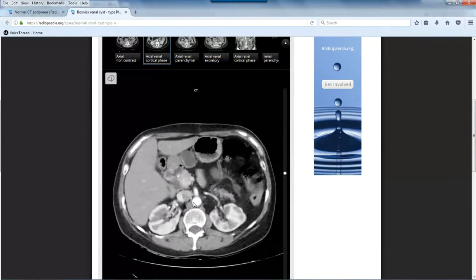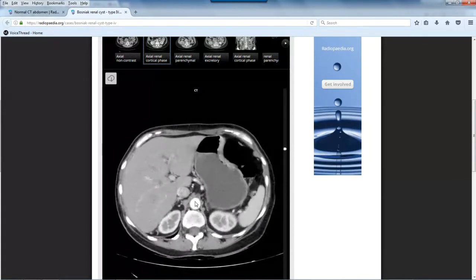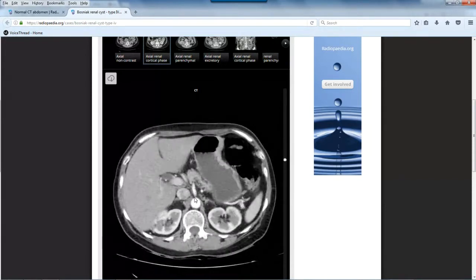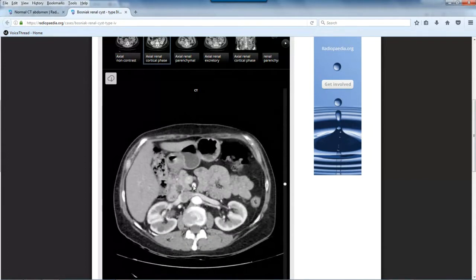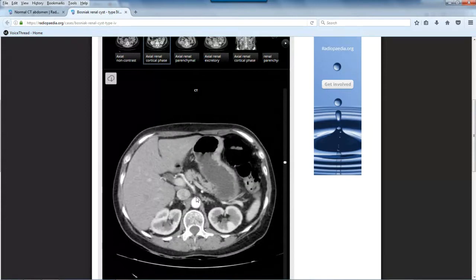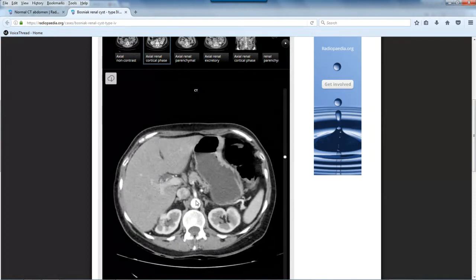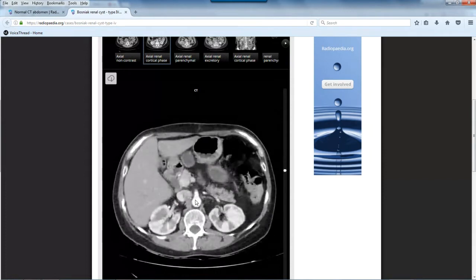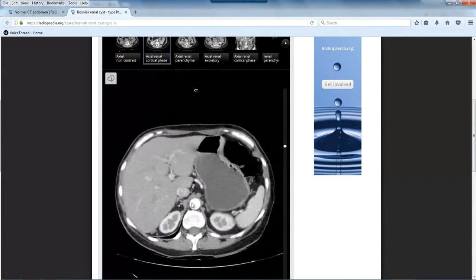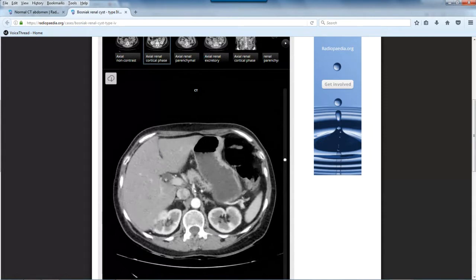The next artery, when we travel from superior to inferior, is going to be, let's go up, your superior mesenteric artery. So there's your celiac. Let's continue down. Here's your SMA, your superior mesenteric artery. And all of your anterior arteries that come off of the aorta travel directly anterior, and then almost all of them take a sharp turn down. And then they might go left to right. So go back up to the celiac artery. It comes over, goes down a little bit, and then it's going to split right and left.